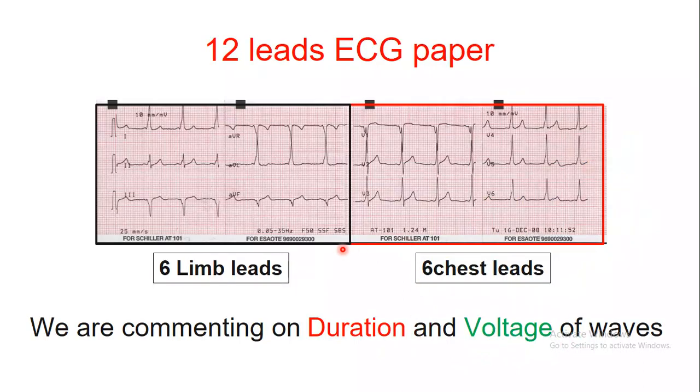And so we have explained the 12 leads that appear on the ECG: 6 recorded from the 6 chest leads, and 3 unipolar limb leads, AVR, AVL, AVF, and 3 bipolar limb leads 1, 2 and 3, recording the difference between the unipolar ones.